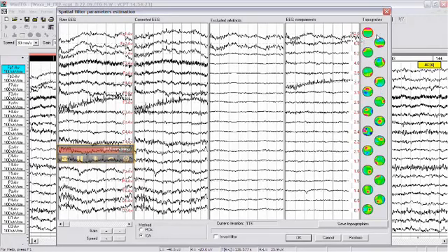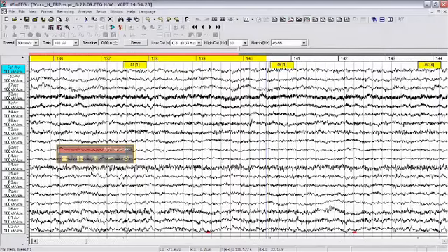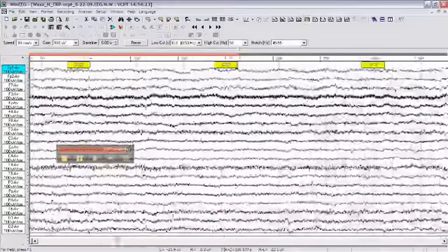In this case, we see only the eye blink topography. This is just the first, the largest topography. So you select this topography simply by clicking on this map, and you press OK, and eye movement artifacts were corrected. As you can see, there is no eye movement artifact in this case.